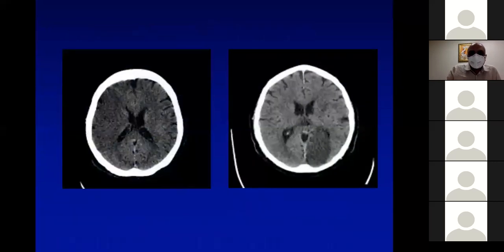All right, this is an ischemic stroke. In this scan, you can identify there is a hypodense area posteriorly in the left cerebrum. Over here, there is a subtle abnormality. You could see that the sulci on the left side are easily identified, whereas when you look on the right side, the sulci are effaced.